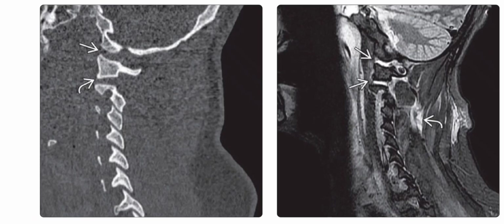So left is the bone CT scan with sagittal reformatting, and it shows the antero-posterior alignment of the cervical spine, which appears normal. However, there is increased distance between the occipital condyle and the C1 lateral mass, as well as widening of the C1-C2 articulation. Right is the sagittal STIR sequence in the same patient, and it shows how MRI better depicts the soft tissue injuries.